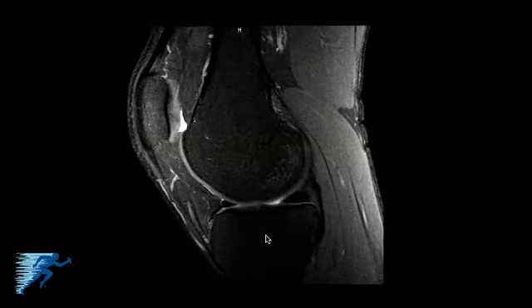which we call the champagne glass drop off. Now we can get more into the medial compartment. Here's the posterior horn of the medial meniscus located along here, and then the anterior horn, and we can start to see the more medial aspect of the patella.